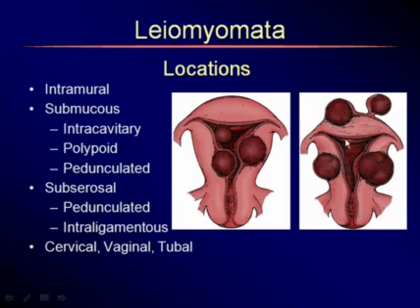Here are subserosal fibroids. So here's a fibroid that is more than 50% subserosal. The physician, then the gynecologist, will attempt this laparoscopically. It will not do hysteroscopic removal. And we can have a subserosal fibroid, it's covered with serosa, on a pedicle, on a stalk, so that's a pedunculated myoma.